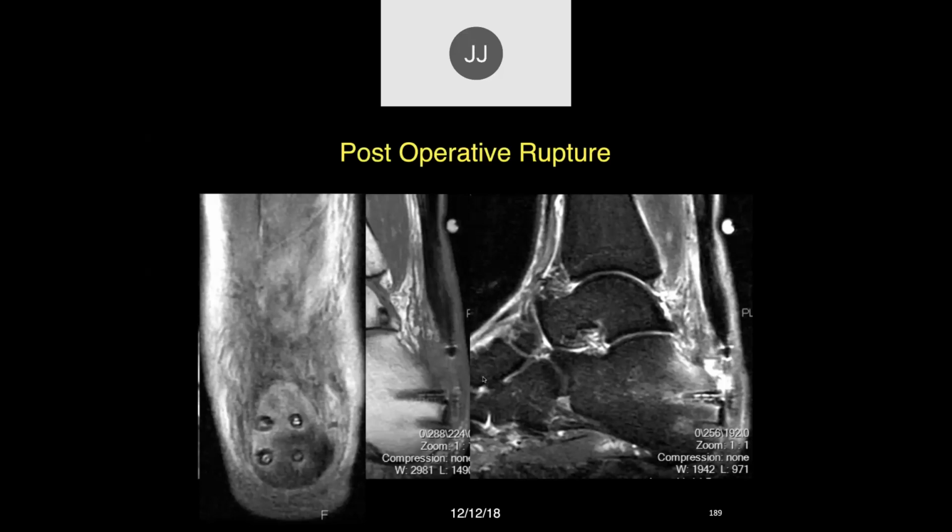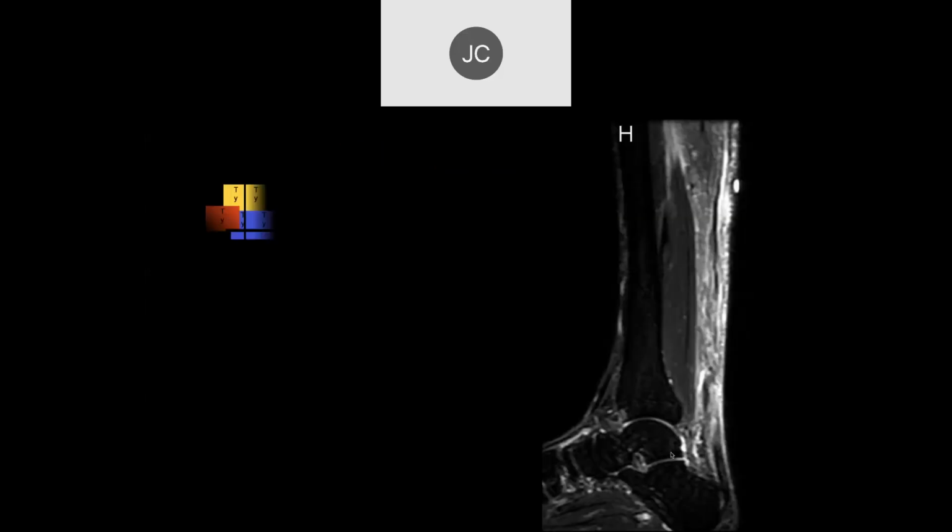Yeah. So this was a post-op rupture of the Achilles tendon. That's a different story. Yeah. And so I see the retraction. What I think happened here, John, is the patient probably tore and fell rather than the other way around. Okay. That could be.